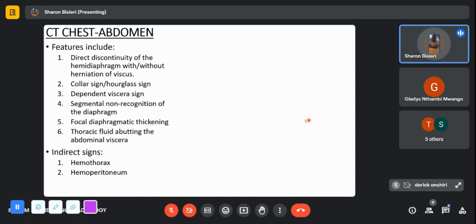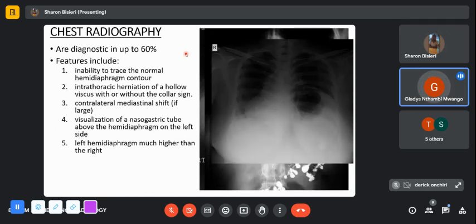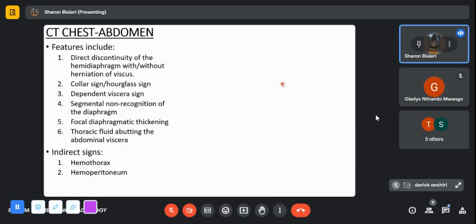And bowel, and even in the frontal image, you can see the mediastinum is pushed quite towards the right, huh? Yes. And then the lateral confirms that quite well. Yes. Thank you. So next, we look at the CT features.